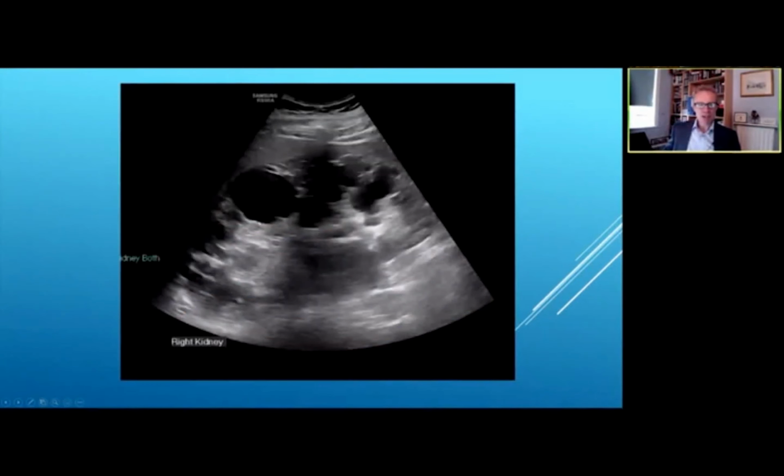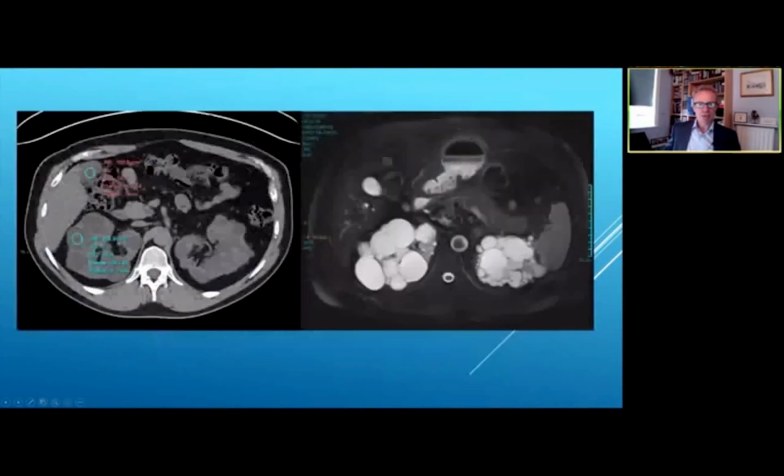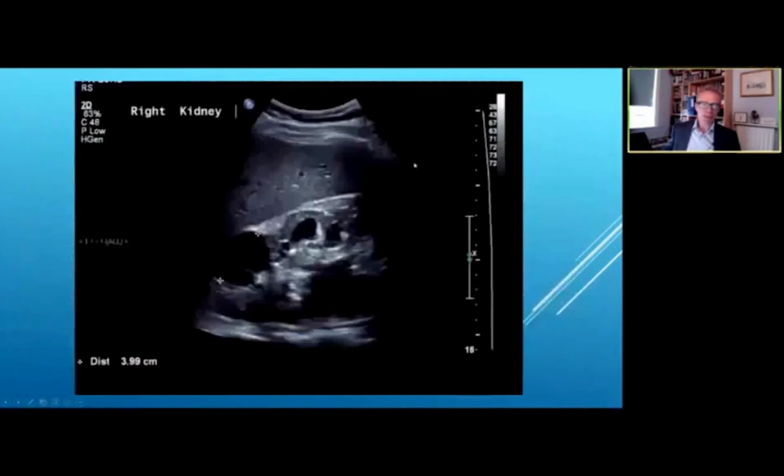Simple renal cyst: through transmission, no septi, no nodules. On a non-enhanced CT, you can see it's got a density of 2 Hounsfield units. Gallbladder is 4, so very similar. On a STIR sequence or a T2 weighted sequence on MRI, very high signal. This patient's got polycystic kidneys. You know this is T2, fluid weighted, because you've got high signal in the CSF, high signal in the gallbladder, hepatic cysts, and fluid in the stomach.